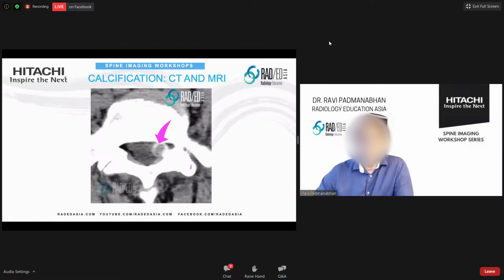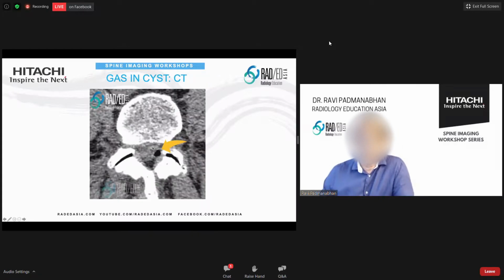The other thing that occasionally you will see is calcification of the cyst, and this will be seen better on CT than it will be seen on MR. And we'll go into that in a moment. But on CT, for facet cysts, predominantly, if you see gas within the thecal sac, within the canal, and they haven't had recent surgery, then you need to think about a facet cyst, especially if it's right up against the facet joint, but they can track.